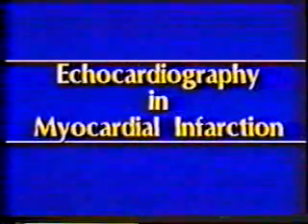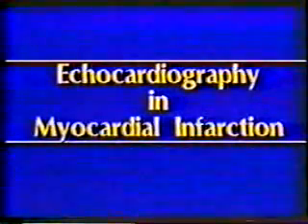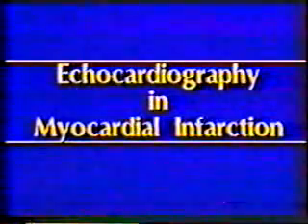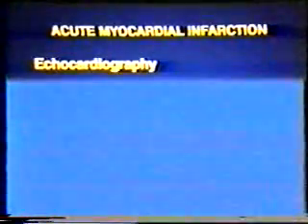Having discussed the assessment of global and segmental left ventricular function by 2D and Doppler echocardiography, we will now turn our attention to the important applications of echocardiography in the setting of myocardial infarction. In our coronary care units, echocardiography is utilized for nearly all patients admitted with acute myocardial infarction.